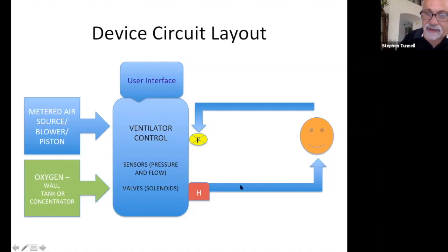So this little guy, this humidifier, is very, very important. To keep the air warm, we employ heated wire circuits. The circuits, if you look inside them, have heating elements, like a heating blanket would. It warms the air, keeps the humidity up, and then delivers to the patient. The patient has something called an endotracheal tube if we're in the short-term window.